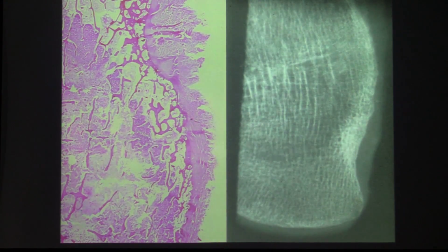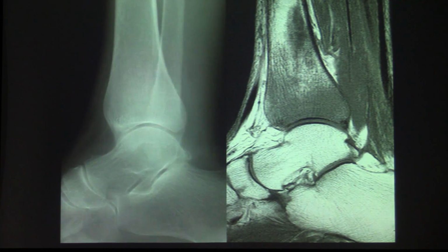Yes, we see it very frequently, and we see it often in cases with MR imaging, where we have the radiograph on this patient with primary osseous lymphoma where it looks pretty normal, and you can see the tumor infiltrating around the host bone, which is still intact.